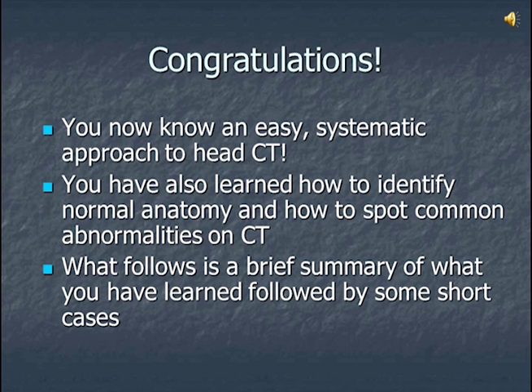Congratulations! You have finished the presentation. You have been shown a systematic approach to head CT, and now should be able to identify major anatomy as well as common abnormalities. We will now summarize.